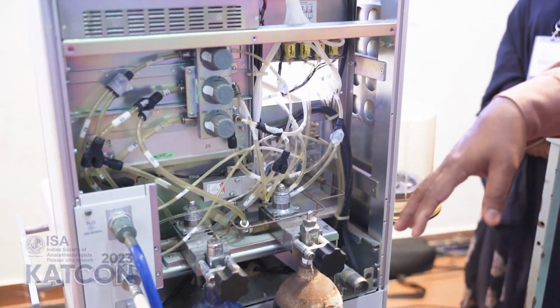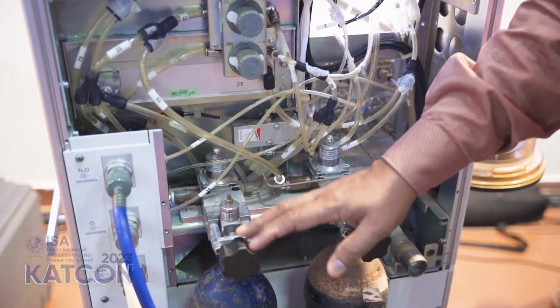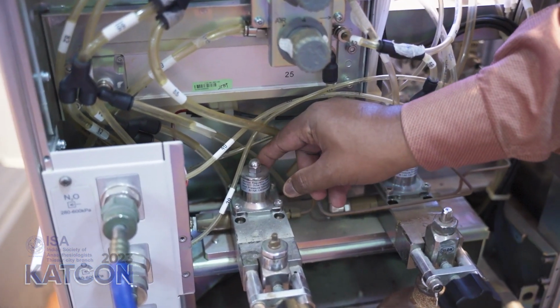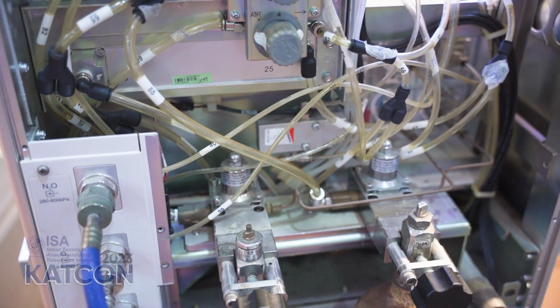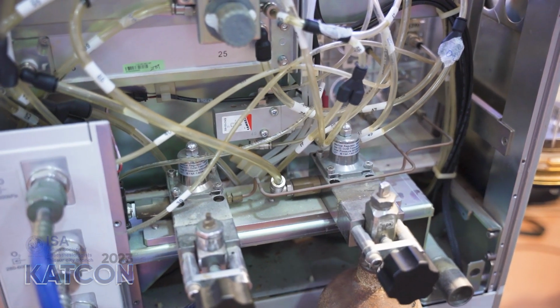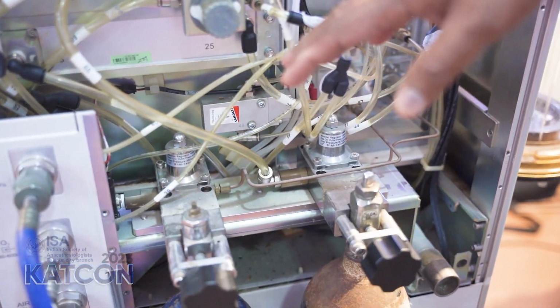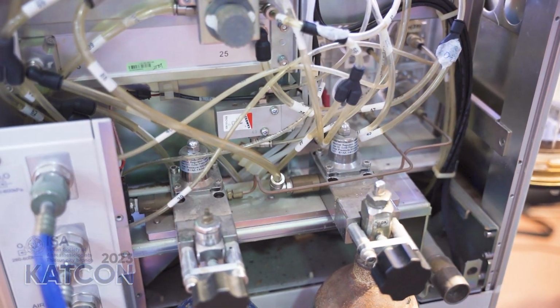Here in the workstation, you can see that these cylinders are placed in the back side, and the pressure reducing valve, can you appreciate it? It is much smaller and different and sophisticated. And all these connections are mainly flexible tubings and transparent tubings. So apart from the old machine, there are too many tubings, and here we have another second stage pressure reducer also. So I will come to that later.